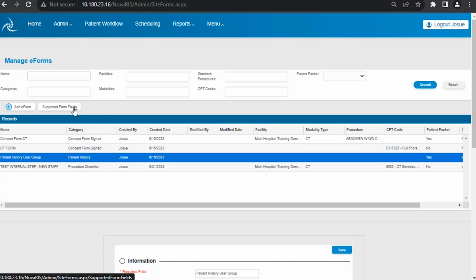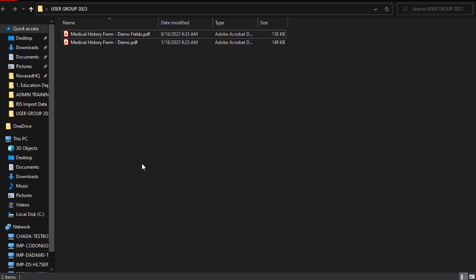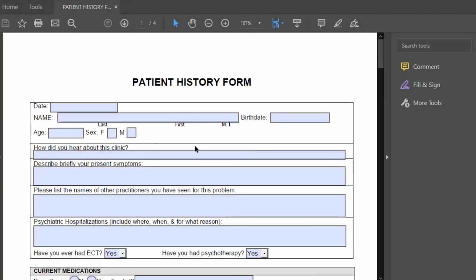One just last thing before we move to the other area, admin tools. When you are setting your PDF documents, so again, I'm just going to show you. So when you are working with your PDF editor, most likely you will want those documents to do 2 things. Again, one, to update the database, but also to be able to pull the information from your database and pre-populate this document. So if I already have my patient name, my date of birth, the age of my patient, and the sex of my patient, I can do that in my PDF editor.